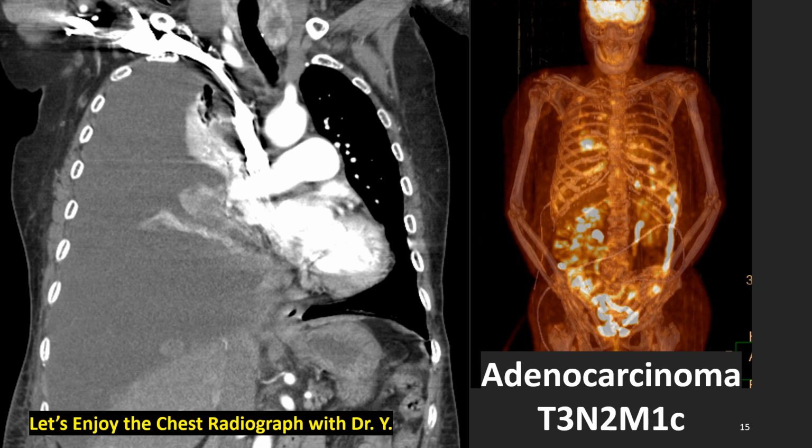Let's look at her coronal CT. Massive pleural effusion compressing the heart to the left side. Middle lobe collapsed, lung with internal tumor mass, collapsed lower lobe, collapsed upper lobe, and pleural nodule, pleural metastasis. This means this is malignant pleural effusion. So M1a staging with collapse, T3 staging.